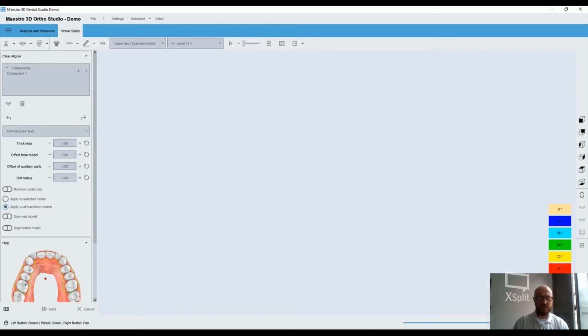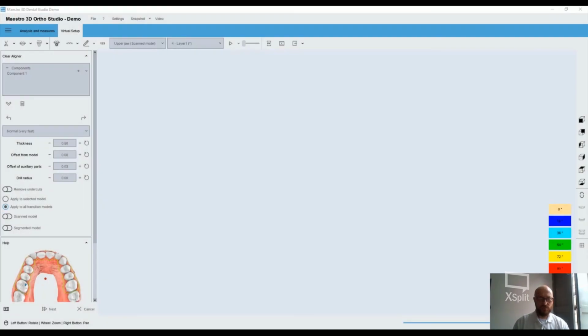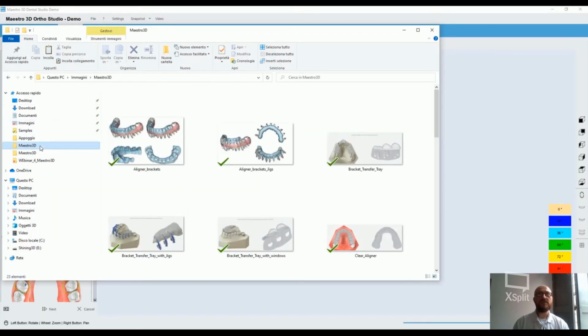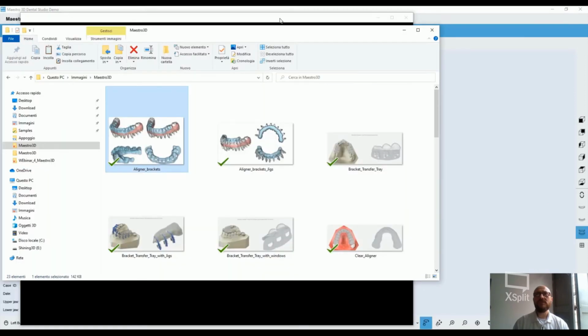Okay, the software is creating. Meantime, I would like to show you some pictures.